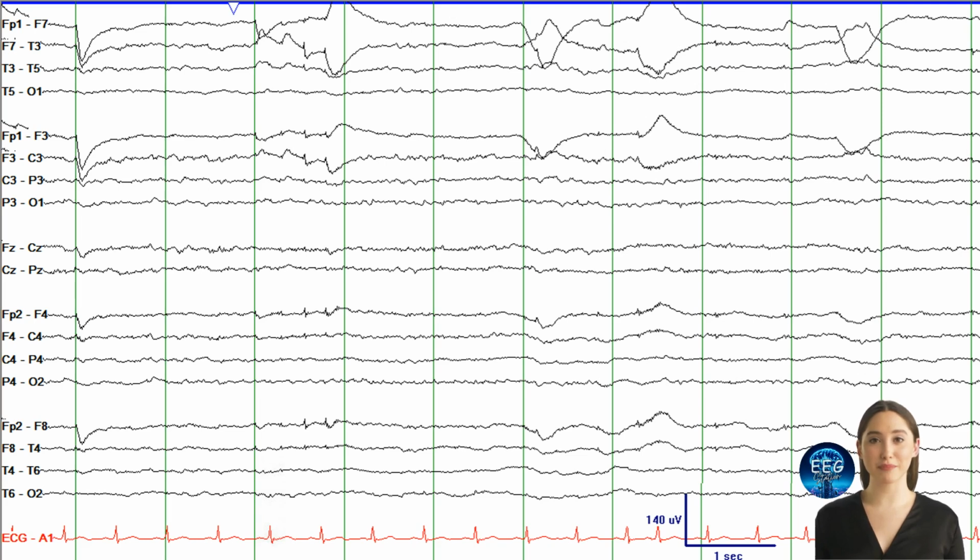Occasionally, an EEG may record REM sleep on a patient with a missing eye. In this example, the patient was missing their right eye due to a previous injury. Note how the swift lateral eye movement artifacts are confined to the left hemispheric electrodes.